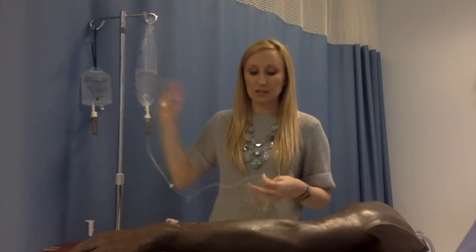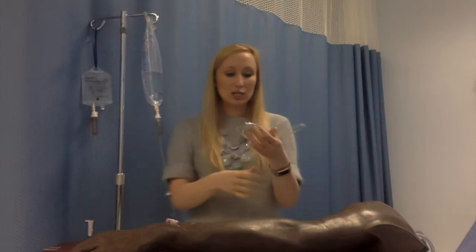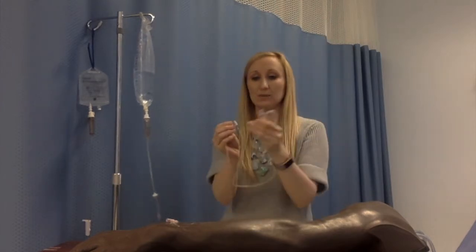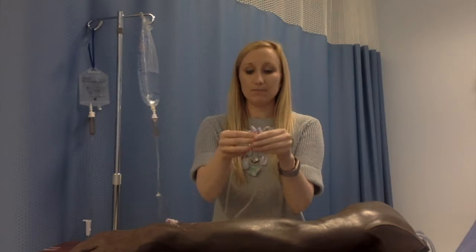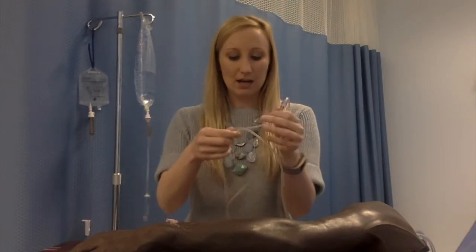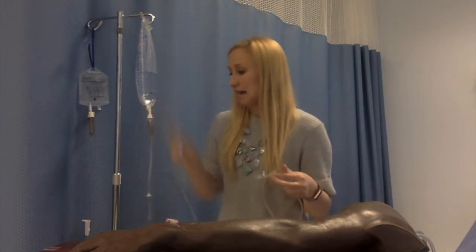It connects to your main source of fluid. That may be normal saline, lactated ringers, or D5W dextrose. On this primary tubing, you have this end that inserts to the patient. You have ports. There could be 2 or 3 ports. This one has 3 ports where medications can be given through these ports, or the secondary tubing can be attached to these ports. And then we also have a clamp that controls how slowly or how quickly, or if you want to start or stop the fluid flow to the patient. So that is the primary tubing.